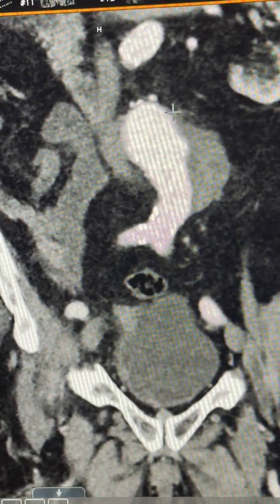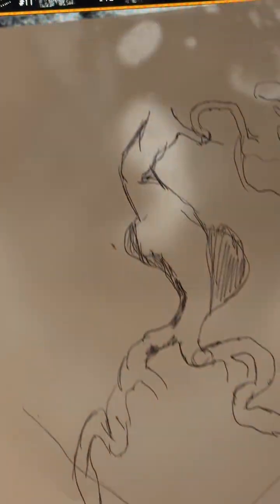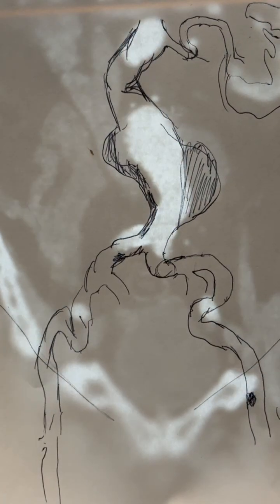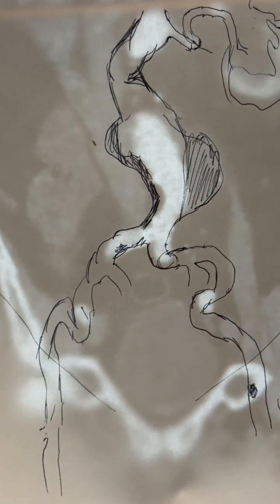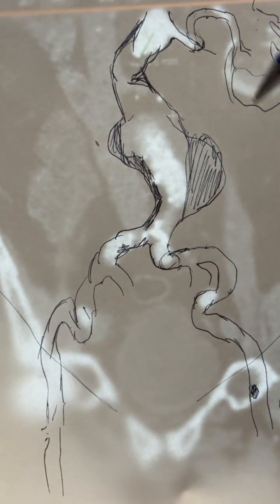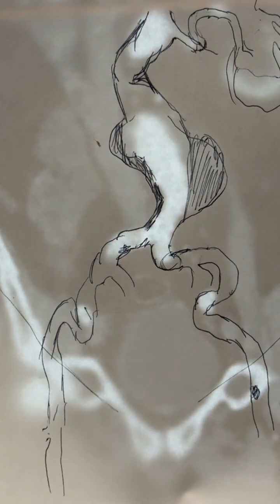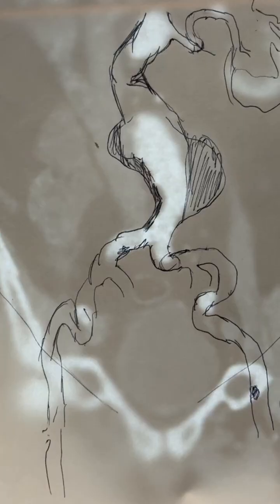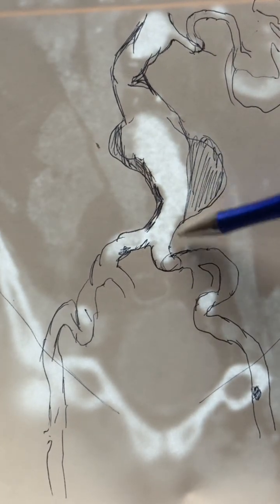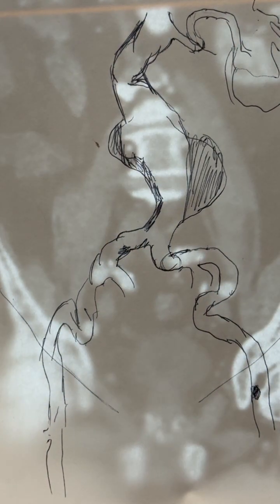So this is tonight's case, and what I like to do when I'm measuring is scroll back and forth until I have the real picture of what it really looks like. I even like to measure out, for example, how the wire turns so that I can follow it when I'm doing the case. I study this tonight and tomorrow before I start my case. I mark out areas of clot and thrombus inside of the aneurysm. I measure the exact corners and how much turn there is, and I try to pretty much draw it and sketch it myself.